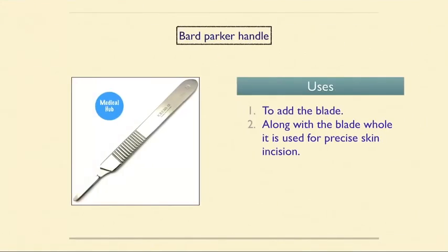Next instrument is Bard-Parker handle. So this is the handle and this is the blade. You can add different blades to the handle. With the blade attached, the whole instrument is used for precise skin incision.